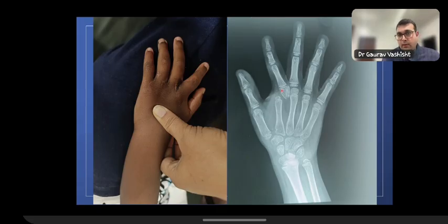So here we are seeing on the frontal radiograph an elongated bone arising from the epiphysis of the proximal phalanx of the second digit, and it's going towards the third metacarpal. So someone says accessory metacarpal, Trevor's disease, pseudoarthrosis, carpal boss.